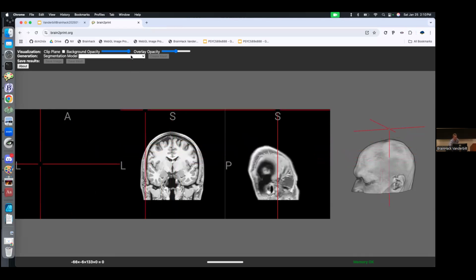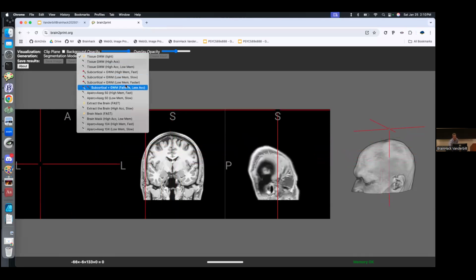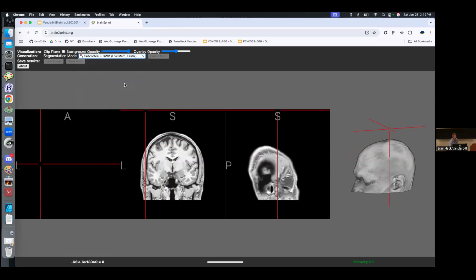But we can then choose some of the AI models to run, and we'll just choose to do a simple model. This is my own personal computer that's running this. It has no fan in it. It's the least expensive computer you can get, but the AI model is running on my computer. And the other thing that's nice as an AI developer is this is great for scale. If you have a model that's really popular and you're letting people use your supercomputer to use it, what if you have 1,000 new users, right?